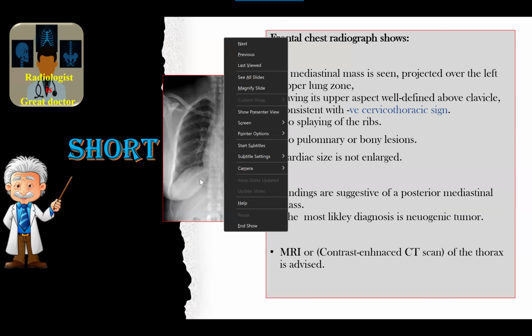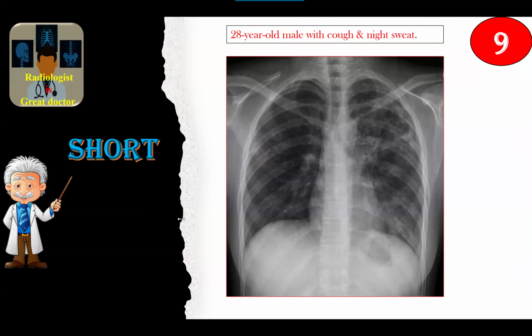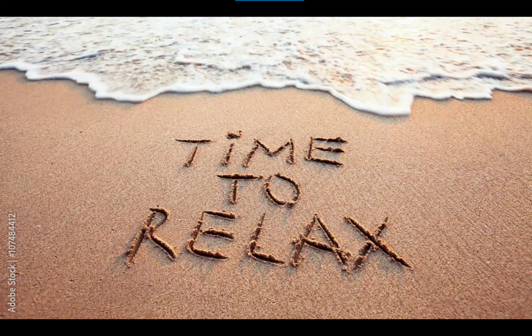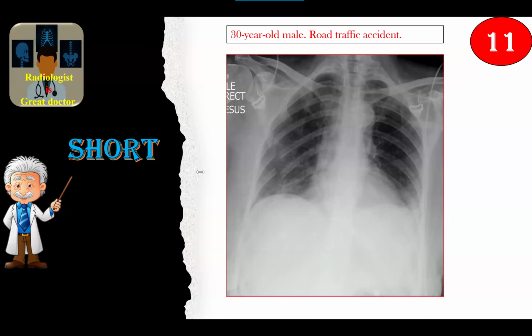Welcome, welcome. Okay, candidate number 10, if present. Yes, sir, she's present. Let me unmute her. Okay, candidate 10, are you with us? Yes, I'm here. Assalamu alaikum, sir. Wa alaikum assalam wa rahmatullahi wa barakatuh. Okay. Let's start with this case.